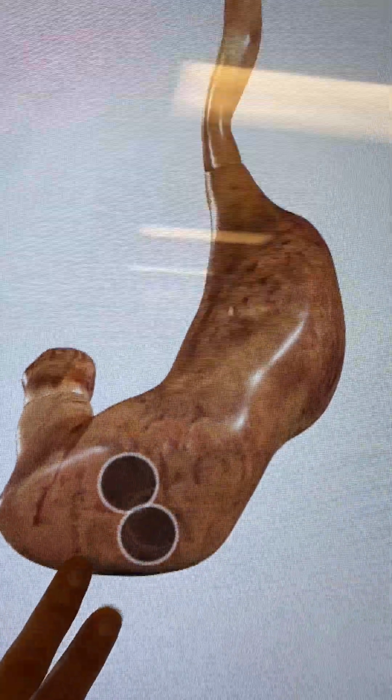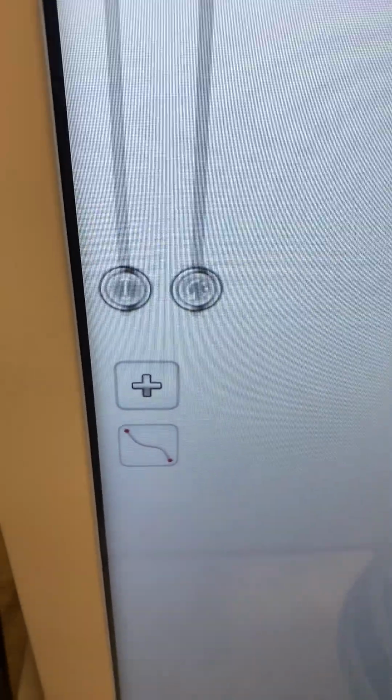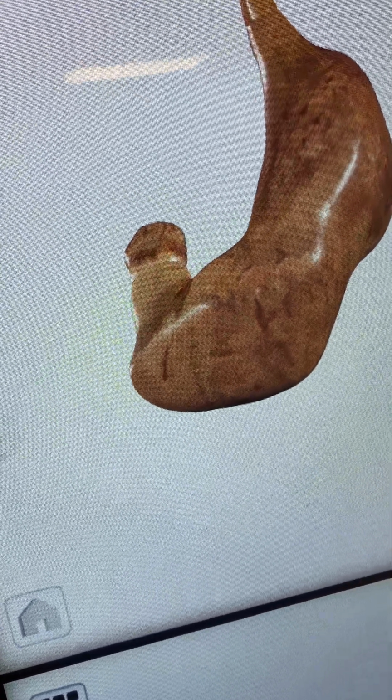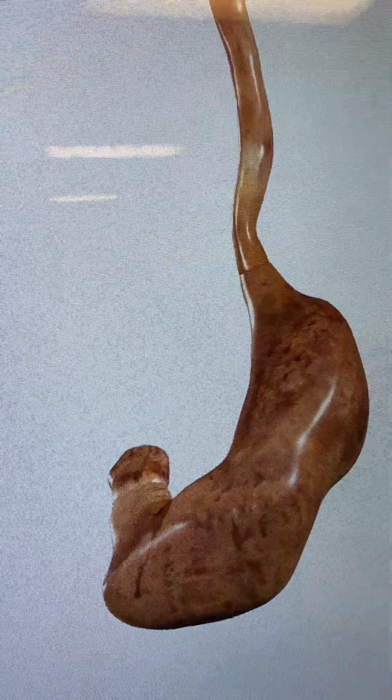When you tap on it, again this is jumping up there. I can bring it a little bit down, and then on the bottom you can see this icon here. The first thing is this 2D. This icon that I tap on is going to take a curved structure and show it in a flat 2D plane.